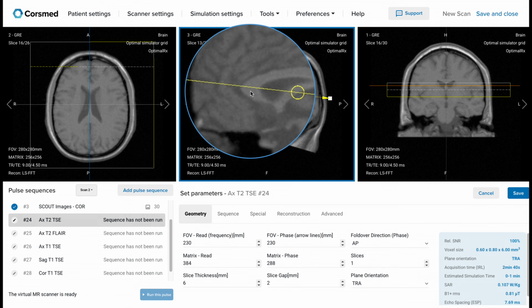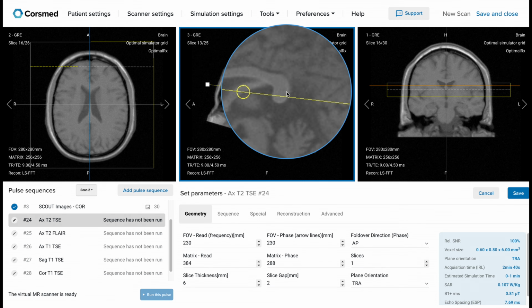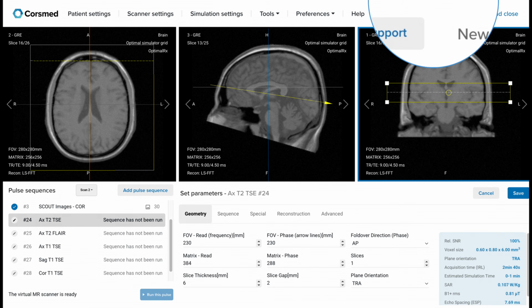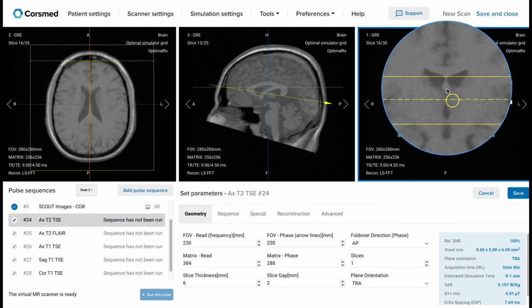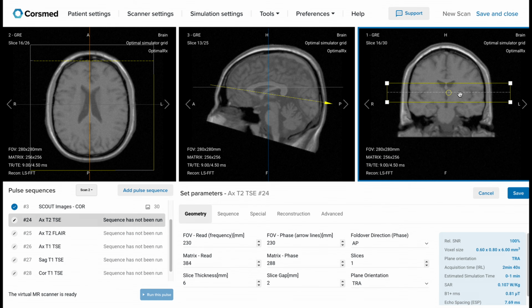Alternatively, we can align it using the genu here at the front of the corpus callosum and the splenium here at the back. So we will position the slice along this imaginary line in the sagittal localizer. On the coronal localizer, we reference the mid-sagittal line. This line runs from the sagittal sinus at the top through the third ventricle and down to the base of the skull. We will position the slice package perpendicular to this line.